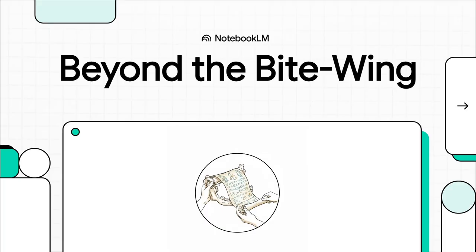If you've ever been to the dentist, you've probably had those small, familiar X-rays taken, right? The little bite wings. But there is a whole other world of imaging that goes way, way beyond those. Today, we're going to take a journey into the bigger picture of dental radiology.